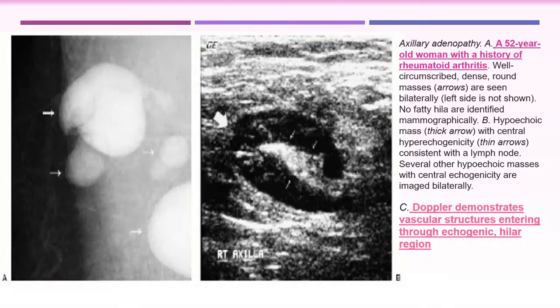We have seen the example of necrosis versus reactive lymph nodes. Though the cortex was diffusely thickened, the hilum, central only. The Doppler demonstrates the normal distribution, even if the vascularity is increased, through the central hilar region.